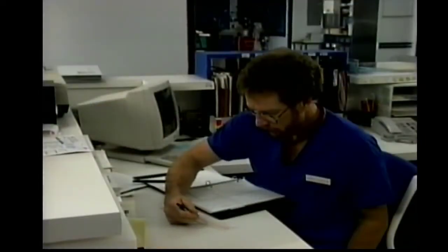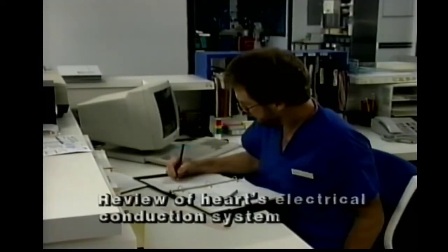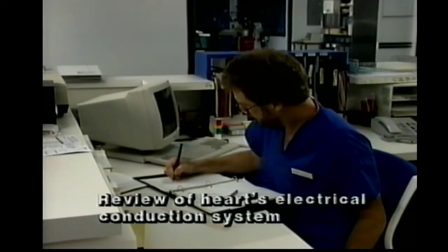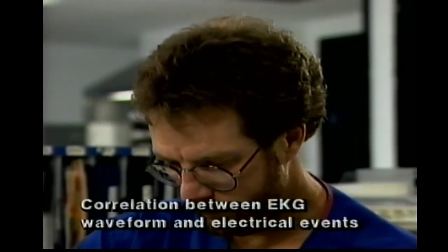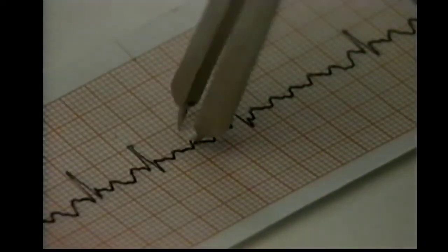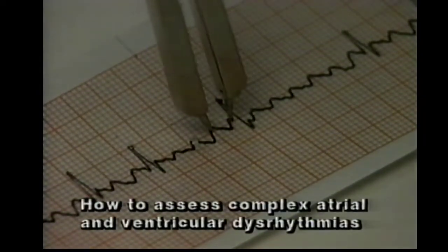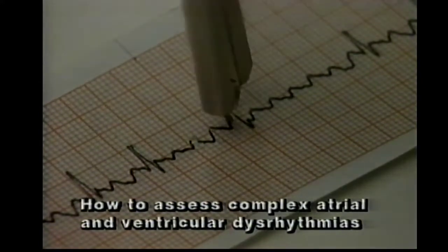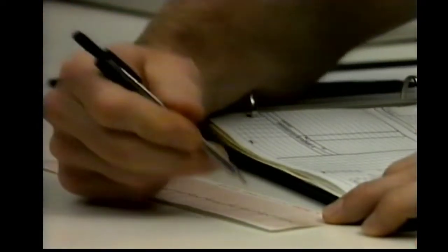This program focuses on recognizing commonly encountered dysrhythmias. Beginning with a brief review of the heart's electrical conduction system, it goes on to show the correlation between the EKG waveform and what electrical events are occurring. It also discusses how to analyze an EKG waveform and shows you how to assess complex atrial and ventricular dysrhythmias. Patient examples are used to help you learn cause and effect relationships, which dysrhythmias are potentially life-threatening, and what treatment is needed.